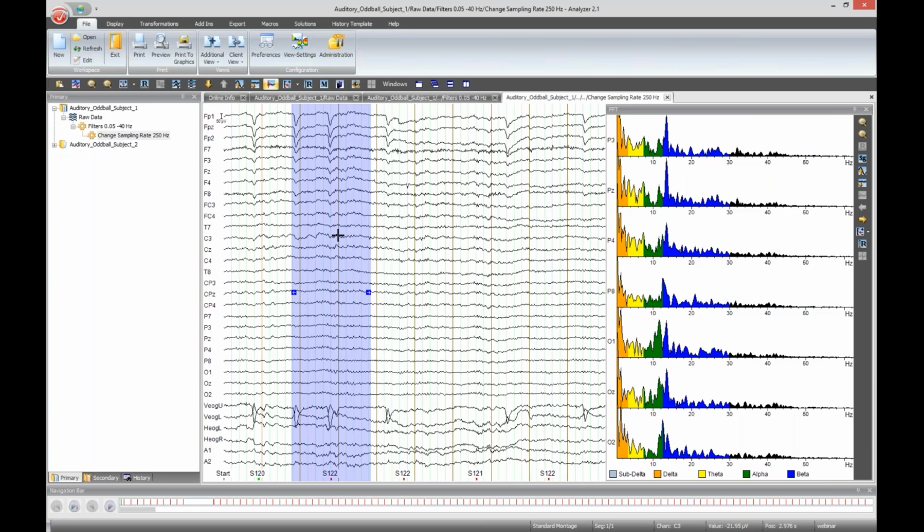So in short, again, Switch View allows to see the data stored in a node using different graphical displays. Transient views allow to compute transformations using only the data points selected by you. Now this output is transient, so it is not stored anywhere and no new node is created.